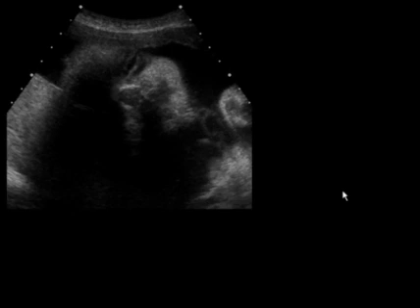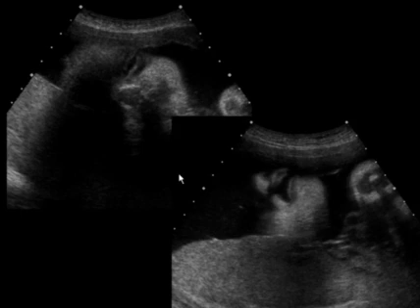Here's a really cute picture of a fetus. The parents were delighted. I show it multiple times. Doesn't it look great? You can see the eyes and the cheek, and it's an adorable picture. Is it normal? Well, you can't call the face normal because you do not see the soft tissues of the nose and lips. Here's the image of the nose and lips.